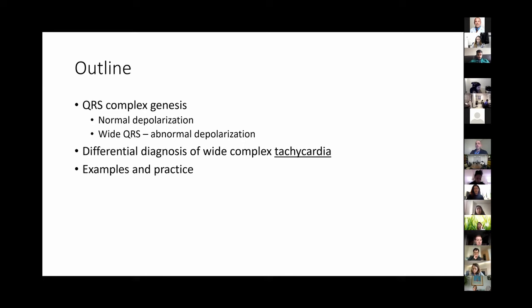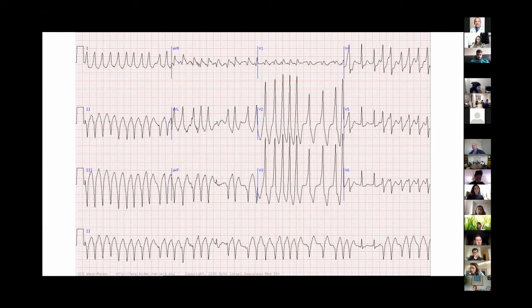So now we can go through some examples and practice. So who wants to start? And I can guide you. We can go over these things. I will tell you, look for this, look for that, and then we can go together. Look, I can start, but I'm going to be a little lost. Okay? Sure. Go for it.